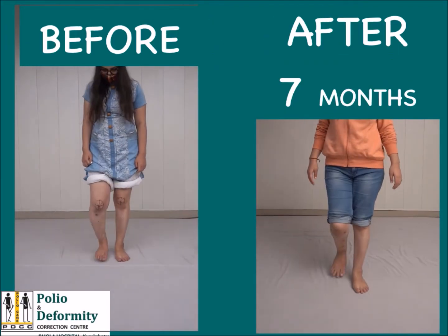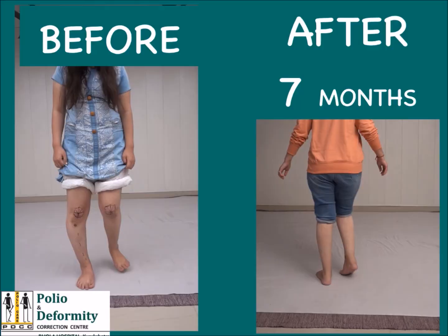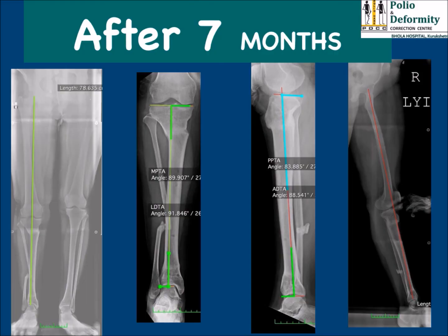This is the same girl which we started with before, and after 7 months, and these are the angular parameters of various corrections after the osteotomy has healed up.